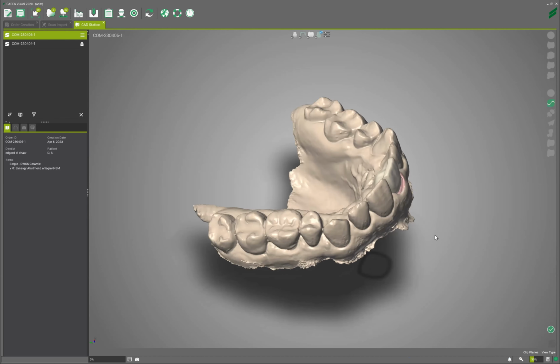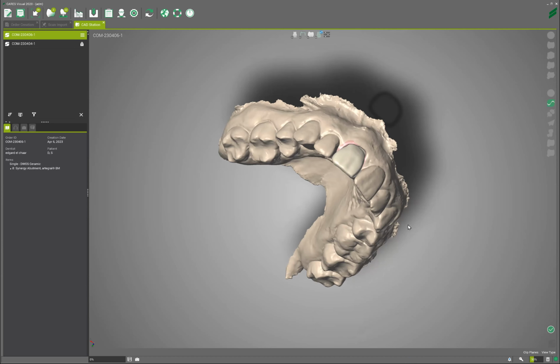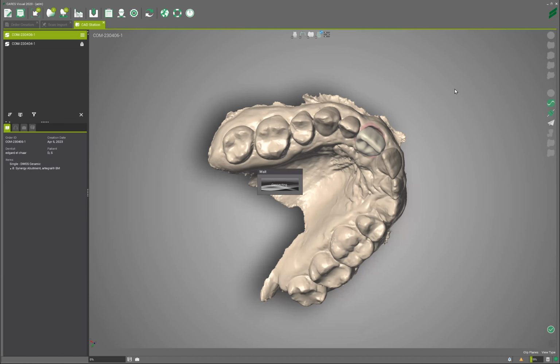And there you go. Now, I don't play anything with this at this point, because if I do, I will waste all my time. So I press at Synergy to connect, and I press this one. All right, so it's connecting now with Co-Diagnostiq. So I go to Co-Diagnostiq.